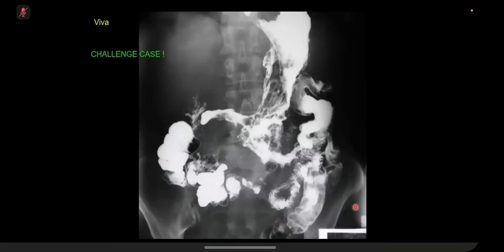Okay. The stomach looks slightly abnormal. There's irregularity of the lesser curvature and the greater curvature, with perhaps some areas of ulceration. The duodenal cap looks a little bit narrowed, but then the D2 and presumably D3 segment looks okay. The distal duodenum and the jejunal loops, again, look abnormal.